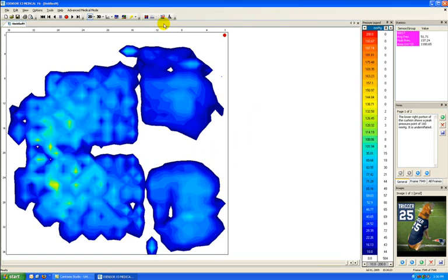Moving on, we can also define sensor groups. The sensor groups option is in the top toolbar almost to the immediate right. Defining sensor groups is very useful if we complete a series of regular measurements. That is, we always know that pressure will always reside on a certain part of the sensor or in a certain way. This is also useful if we want to draw out data for a particular area of the sensor where we've seen an interesting measurement.